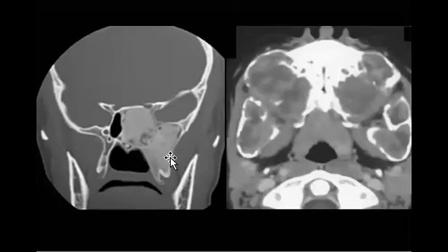With this ground glass appearance, this bony lesion, you can see that sometimes it looks like an aggressive lesion, but with bilaterality, look for fibrous dysplasia. And this is another shape of fibrous dysplasia, which has names like cherubism or leontiasis ossea, the lion face.